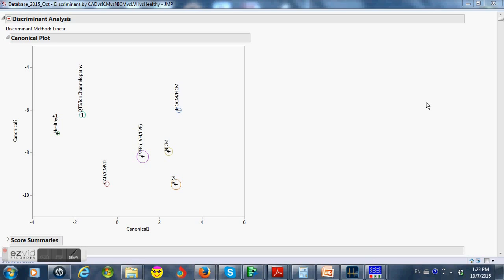Now we go into discriminant territory. Now we really like this technique in terms of its ability to visualize where your patient lies versus the underlying groups in the database. This is the healthy database. We're showing number 1 who lies up there. Result comes in healthy. This is coronary disease group down here. Left ventricular electrical remodeling group, or essentially left ventricular hypertrophy or enlargement, talking anatomically. Non-ischemic cardiomyopathy and ischemic cardiomyopathy groups, a hypertrophic cardiomyopathy group, and finally an ion channelopathy group that's made up of mostly long QT patients. So our patient number 1 is essentially orbiting the healthy planet, so to speak.